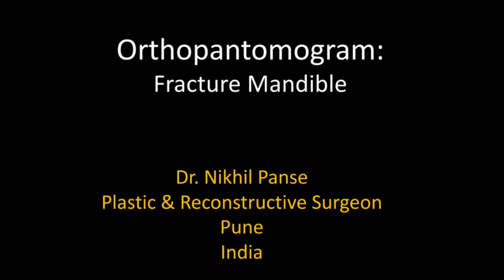So hi guys, in this X-ray we will be discussing orthopantomogram. So orthopantomogram, as we all know, is a panoramic dental X-ray that captures the maxilla, mandible, teeth, temporomandibular joint in one single image. So in this video we will discuss a very few basics about the OPG, and then we will read one OPG of fracture mandible.